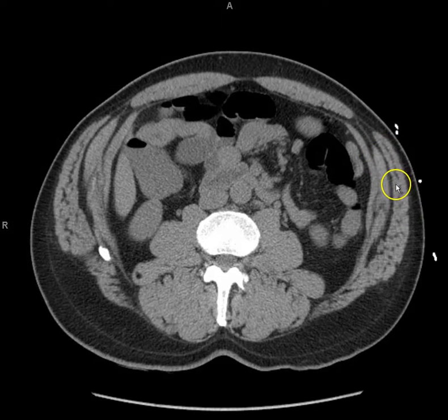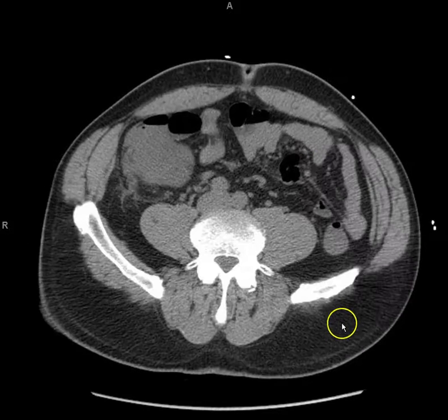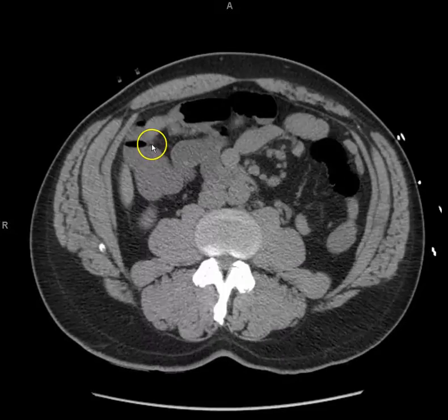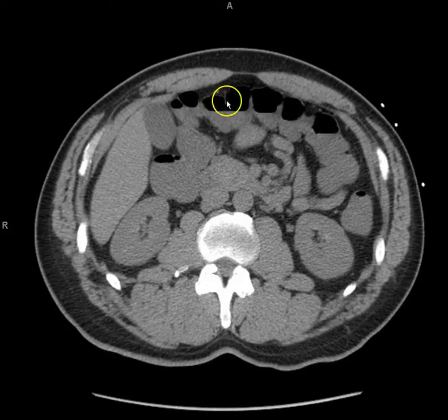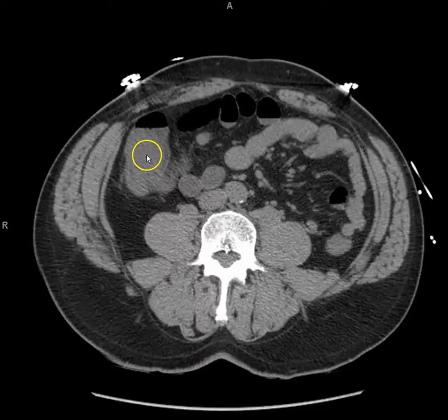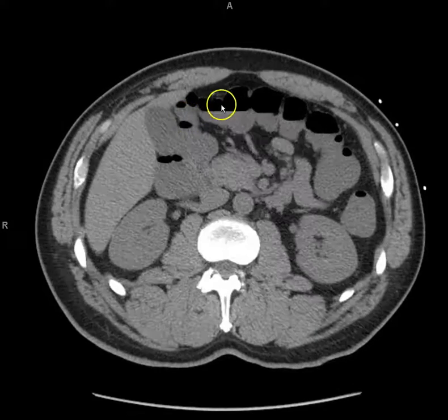And then, so this is external oblique. He's actually very muscular, internal and transversus. Okay. So if it was fat, it would be darker. Fat is like this. This is fat. This is fat. Okay. So go back up and you see this organ here. What is this? I'll follow it for you. Comes over here. This is the ascending colon. This is the hepatic flexure of the ascending colon, and then going to the transverse colon here and coming across, right?